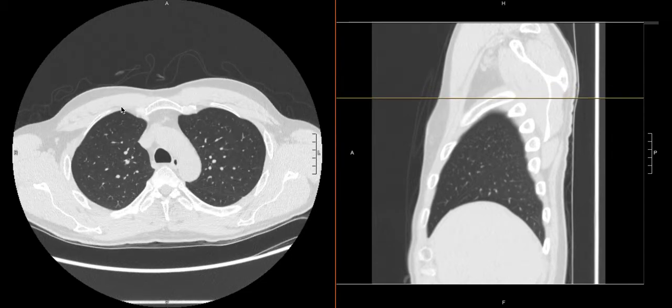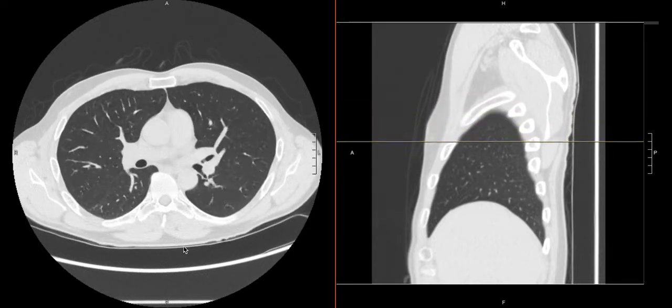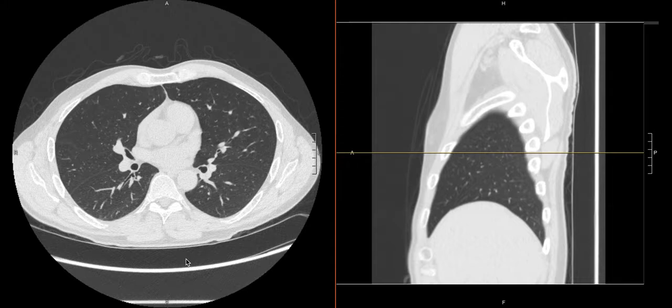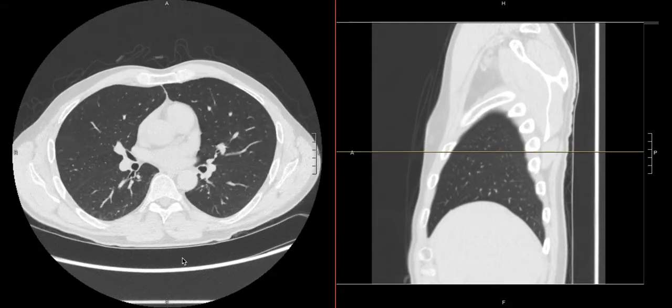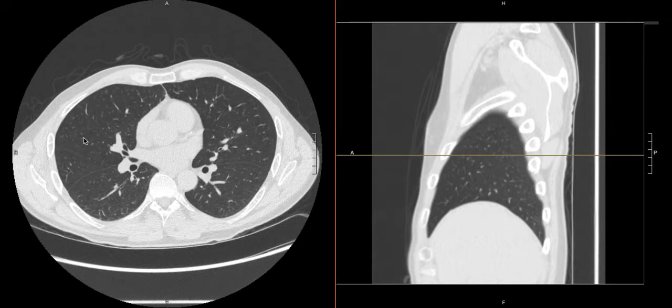Maybe you're going to split a lobe up into quadrants in the beginning before you get more comfortable being able to detect things. But basically what you want to do is look at the entire lobe, and this is where it can be really useful to co-localize here and see where you are. As for the fissures, this is the oblique fissure here, and this is the horizontal one. It can be a little hard to appreciate what's going on, but this is all still right upper lobe.